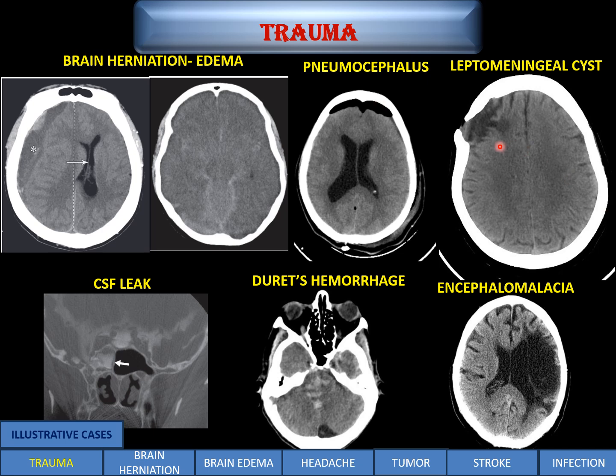Coming to leptomeningeal, a patient who has a fracture in which the CSF containing structures leak out and it presents as a boggy pulsatile mass lesion. CSF leak, these are things which we see in the post-traumatic sequelae or follow-up cases. In CSF leak, we are able to see contrast which is administered in the subarachnoid space moves into the right sphenoidal sinus, which means that there is basically a break in the roof of the sphenoidal sinus.